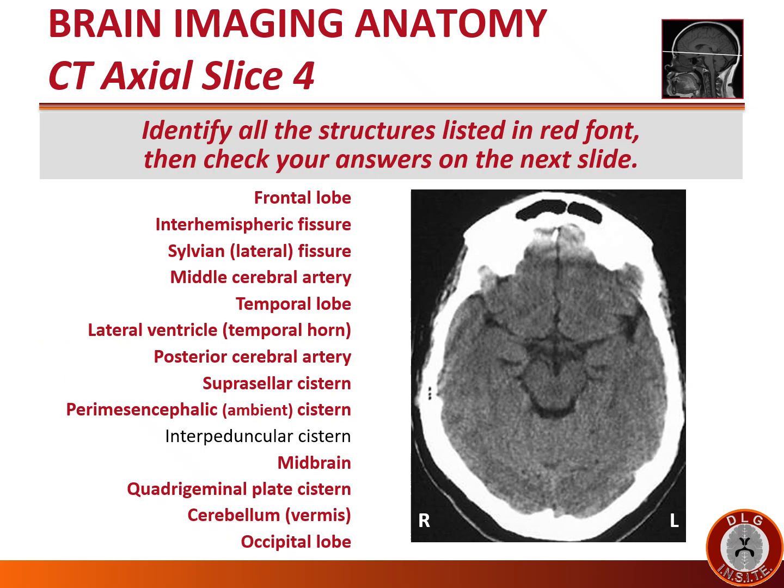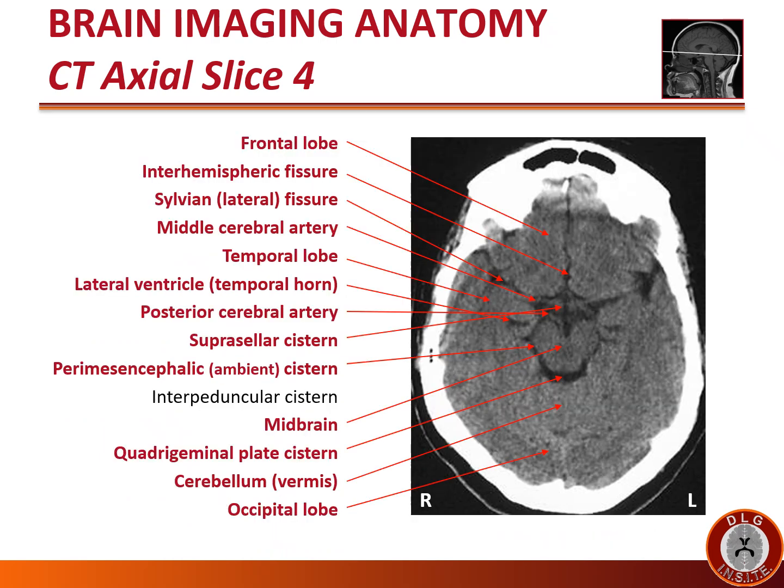Please pause for a moment to identify all the structures listed in red font on the slide. Then check your answers on the next slide. Please spend some time on this slide carefully reviewing the correct locations of the structures listed in red font.